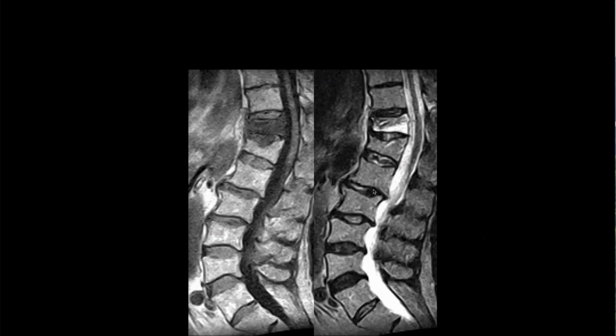T1 and T2. Yeah, T1 and T2 is a low field, old image. So it looks like there's a compression fracture at some mid-thoracic level. Okay. Yeah, now what we see here are two different ages. Here's an old compression fracture, and this is probably a variant anatomy here. Because we don't see much edema in the lower vertebral body that's involved, we see acute type edema up above. So this is probably a chronic lesion, and this is an acute fracture.